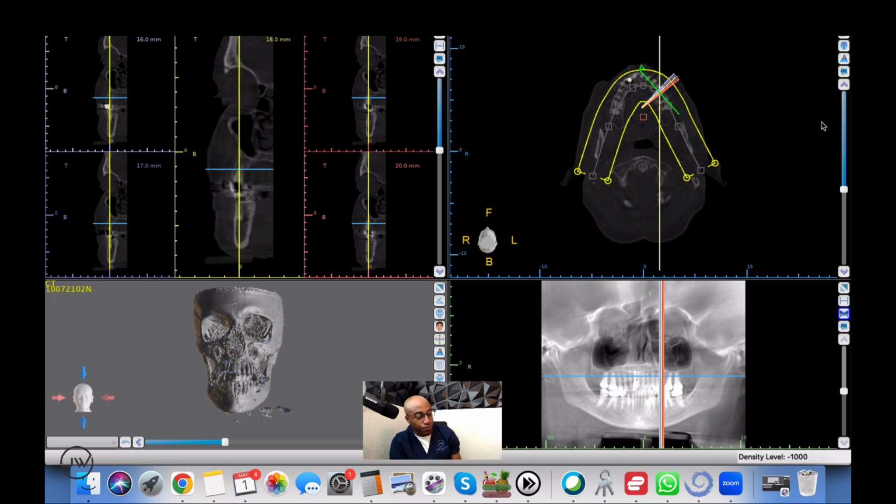There are different ways in which you can receive the software. You could either go on your desktop and drag and drop the file into the actual software, or you could do it manually or online. I have the old school version. I'm actually doing it on the CD. And unfortunately, I have to treatment plan it myself, because if it were digital, I could just send it to my team and they could take care of it. But work for me, blessings for you. All right, let's jump into it.